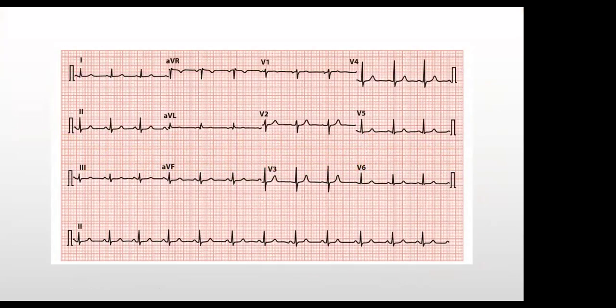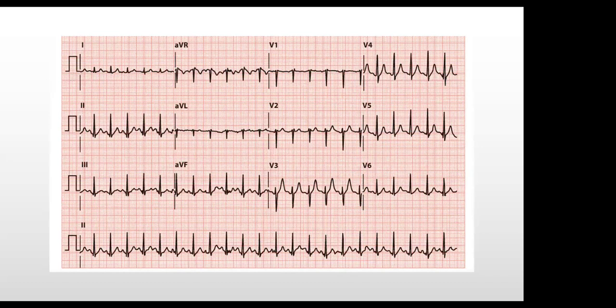So tell me, what's this? That's a normal ECG. Normal ECG. I just want to be sure that you are not carried away with abnormality. So this is a normal ECG. So what's this? Quick one. Sinus tachycardia.